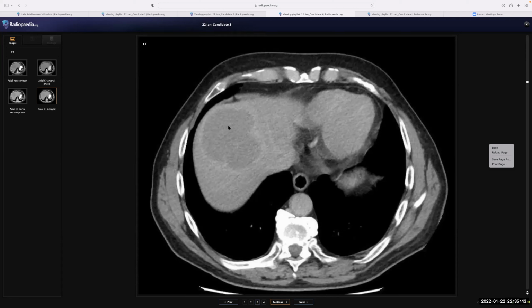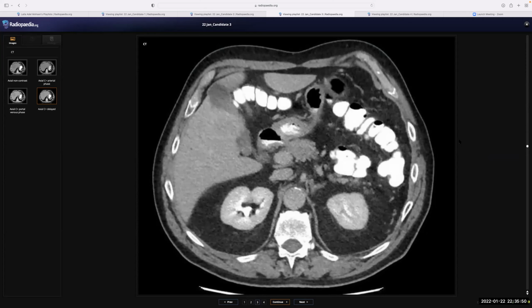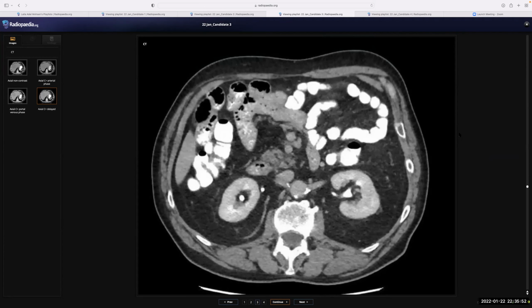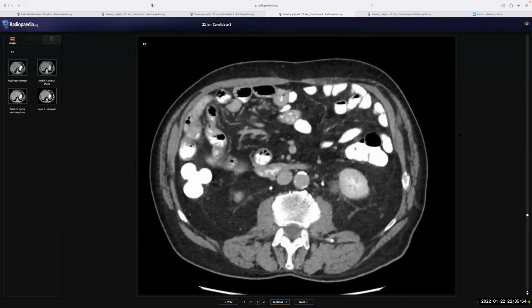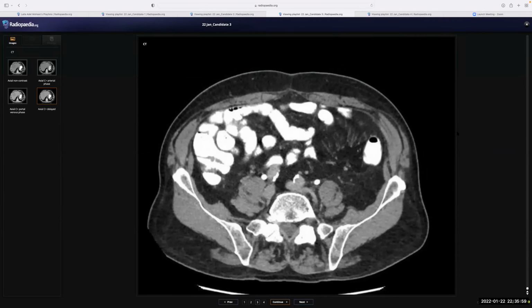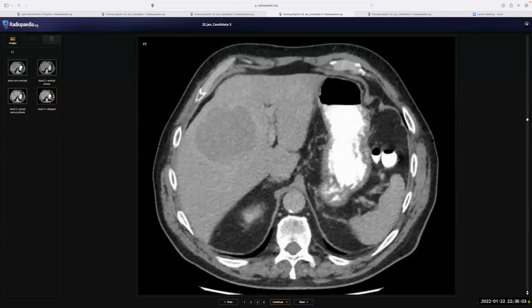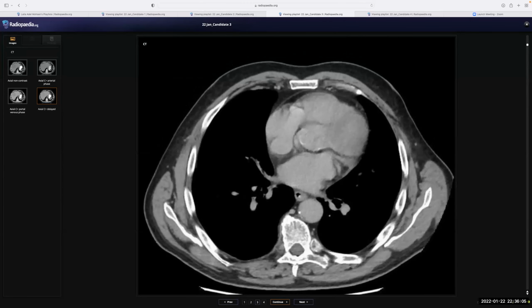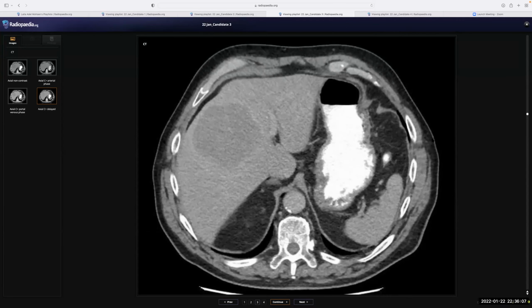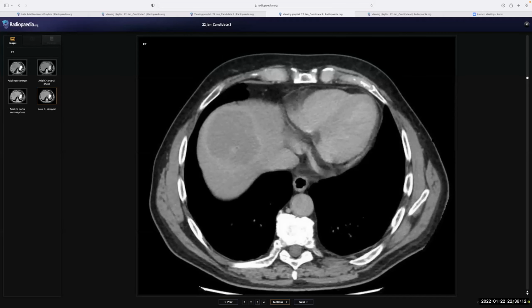in a normal liver parenchyma. And when I look at the other structures, the surrounding structures, there is nothing remarkable in the liver, in the kidneys or the mesentery. I'm trying to look downward if there is any other possibility. So this is a hepatic lesion of low density. Also, it is not cystic in nature, I think. This is a soft tissue.